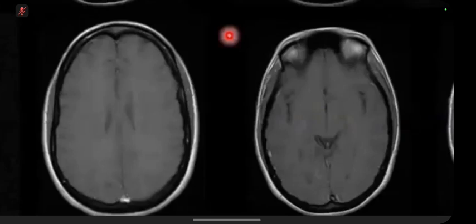This patient, on his first presentation, they were suspected of demyelination. Over to you. Let me tell you the sequence is FLAIR, FLAIR, FLAIR, DWI, DWI. I have not given you ADC, non-enhanced T1, non-enhanced T1, contrast enhanced T1, contrast enhanced, FLAIR, FLAIR.